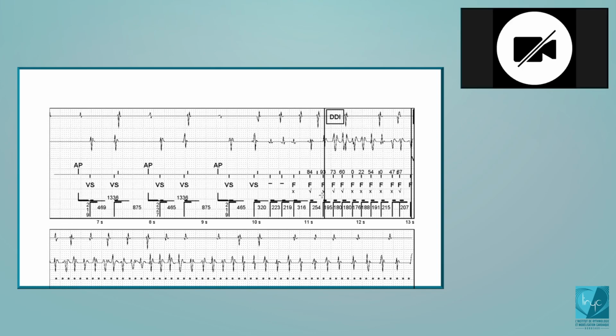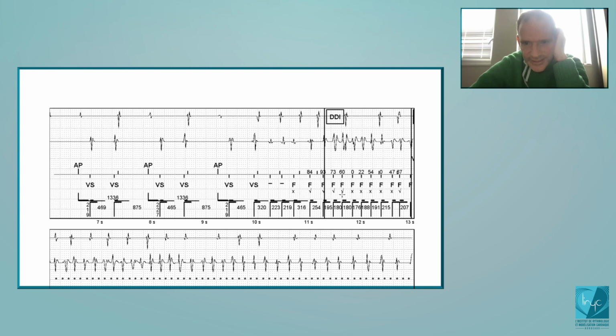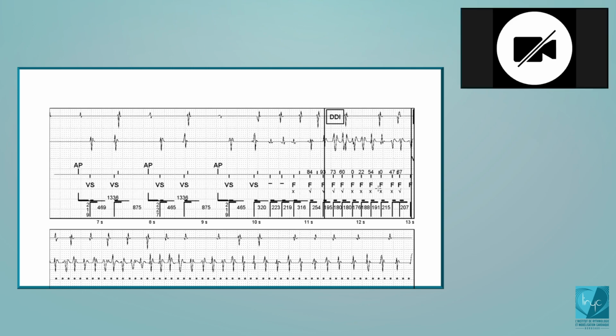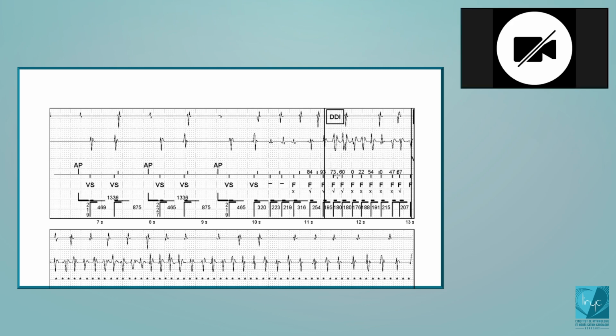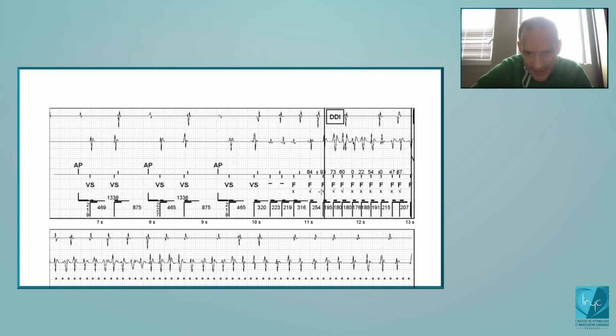Okay. So what are these signs here? You see X and this one? They represent the discrimination symbols. Yes, this is the discrimination based on the morphology of the signals. This sign translates a high percentage of similarity with the reference, so it is supposed to be similar compared to the reference. And this sign explains that this is different. And you see these are low percentages.